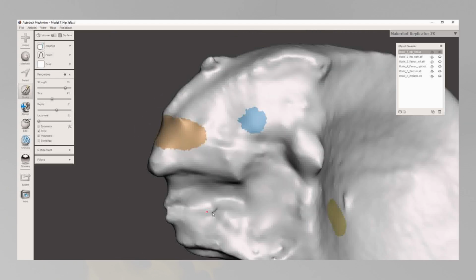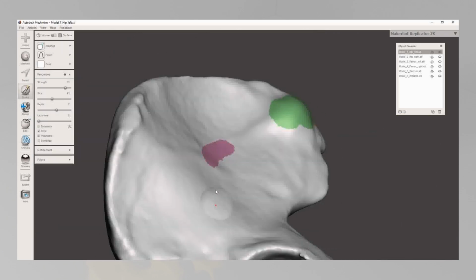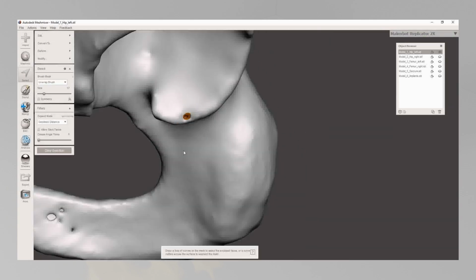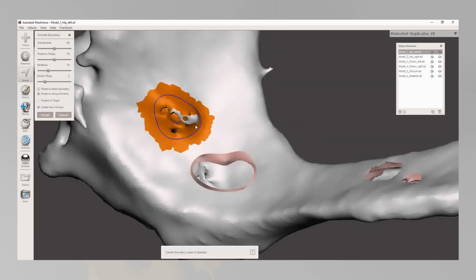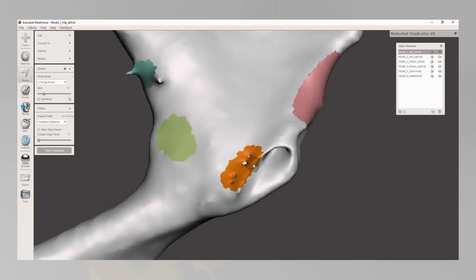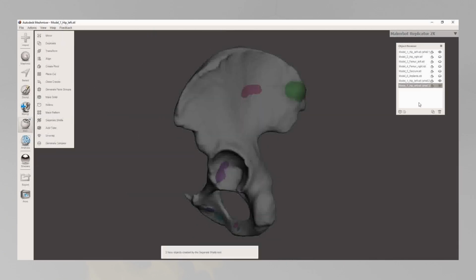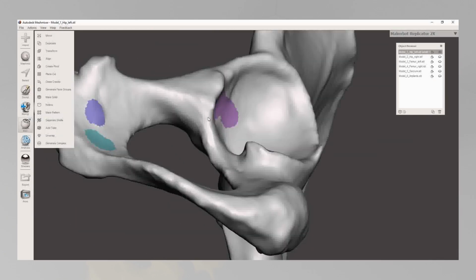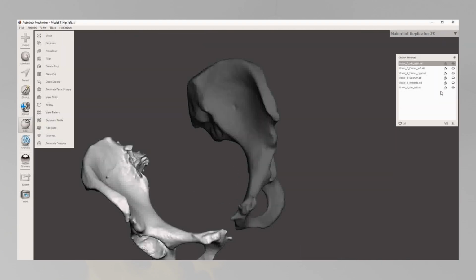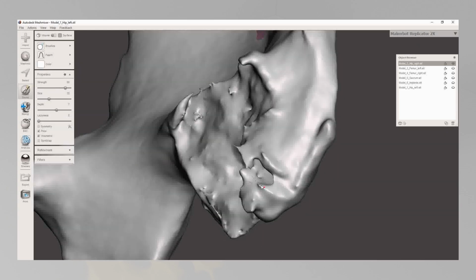When working on the digital model, it is important to be very careful not to change the size of the model or remove relevant structures. Remember that the final product must be a detailed replica of the patient's anatomy. Otherwise, misinterpretations may occur, increasing the risk to the patient and prolonging the duration of the surgical procedure. It is therefore always helpful to re-import the final digital model into the software used for the initial segmentation and compare the result with the original DICOM images.